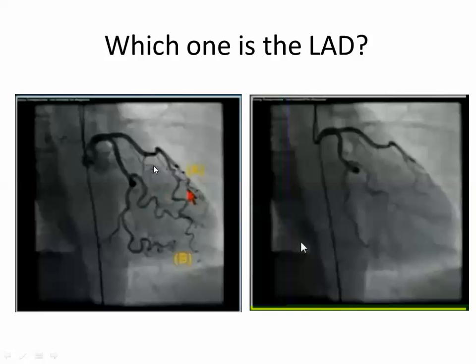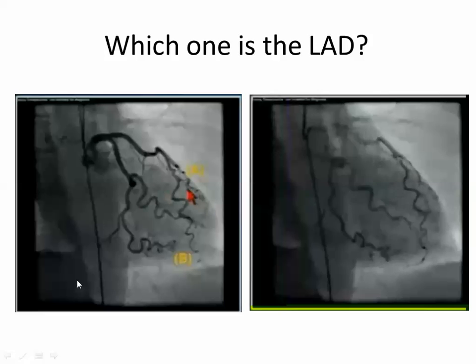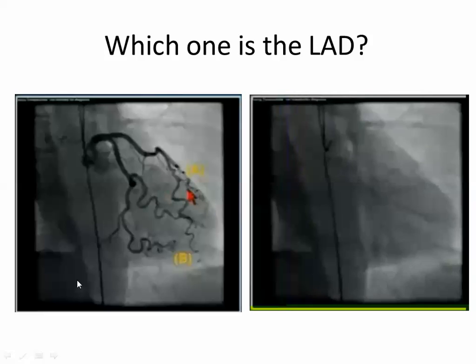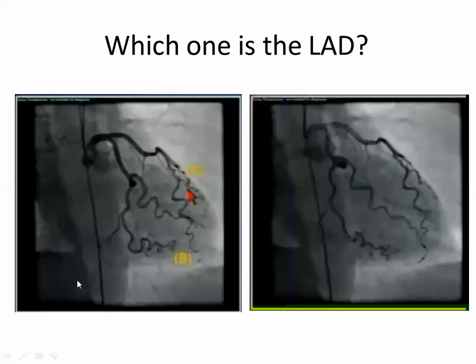Okay, which one is the LAD? This is a question. Dr. Marwan will answer, and Dr. Ayman will answer. Is it A or B? This vessel, or this, or this?